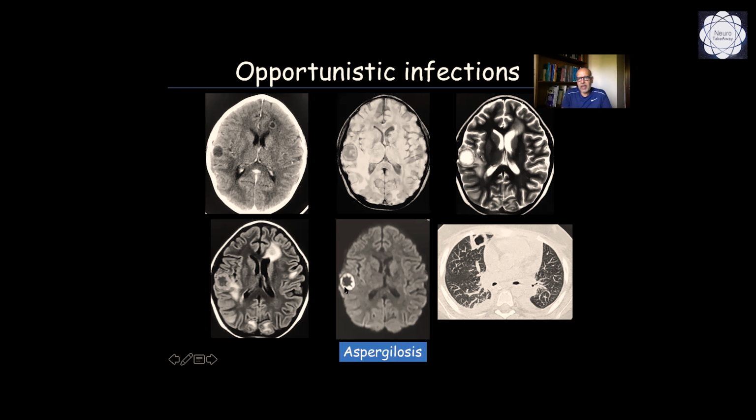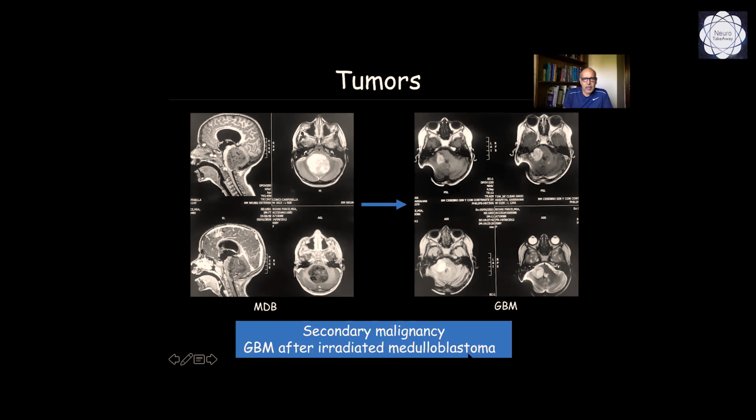This is the typical finding, but sometimes we had the opportunity to see a combination of different patterns with typical abscesses, granulomas, infarcts, because this is an angio-invasive fungus. It's important to look at the CT of the lungs, because there sometimes you see typical lesions as well.